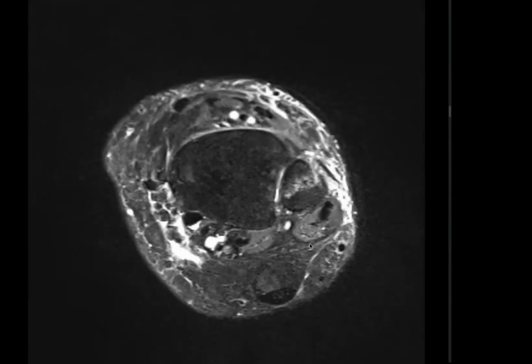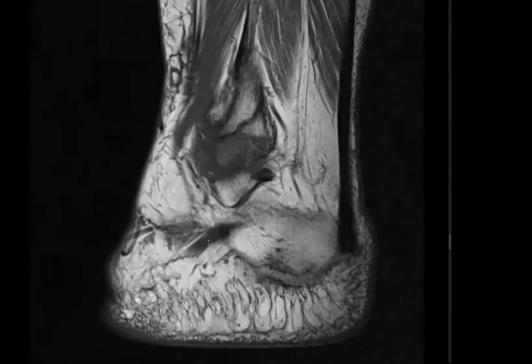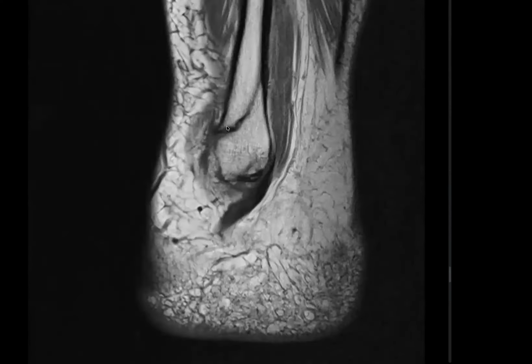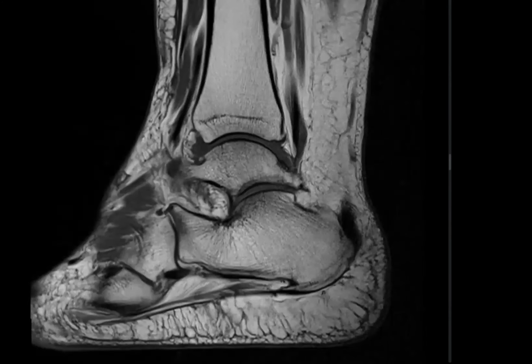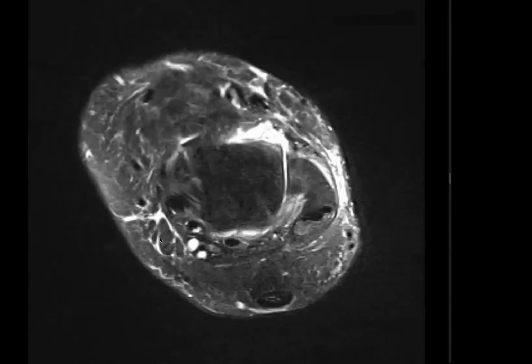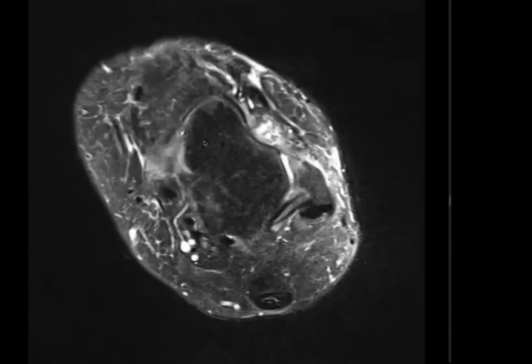That's never what's going to happen. So in this case, I want you to be a bit more confident when you say this. This is a clear fracture. You saw the line, you called it an irregularity, but it's transcortical. It's going from this cortex to this, and this is clearly a fracture. You noticed it in the end, but be more definitive.